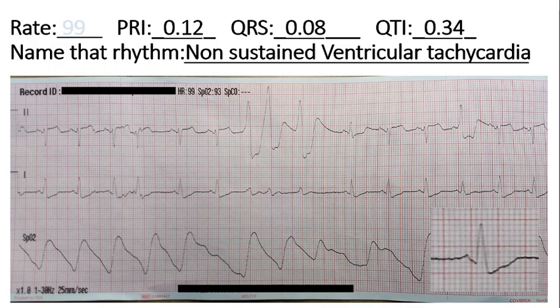And I would imagine if I was feeling the pulse right here, that when this non-sustained VTAC happened, you would have a long pause, probably almost a 2.5, 3 second pause, which would be concerning. But it wasn't enough for the patient to feel, and he didn't do any more of these, so we just kind of watched him closely for any changes and made sure he didn't have any chest pain or anything.